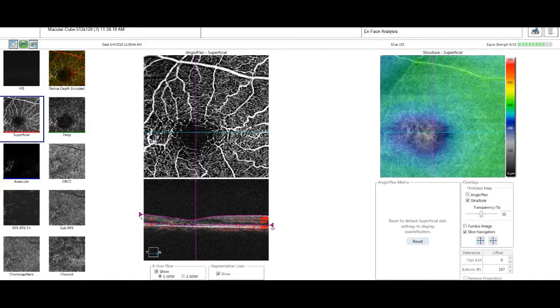I used to do a lot of fluorescein angiograms to check these patients. At this point, I really do it only in suspicious cases of choroidal neovascularization where I'm not sure. This case is definitely no choroidal neovascularization, but I did get the OCT-A, the OCT angiography, and this area of vessel, where the vessels are really very sharply angled out from each other, is abnormal, as are these areas of capillary dropout.